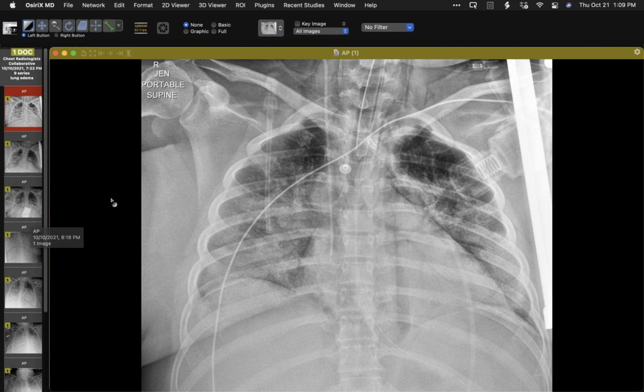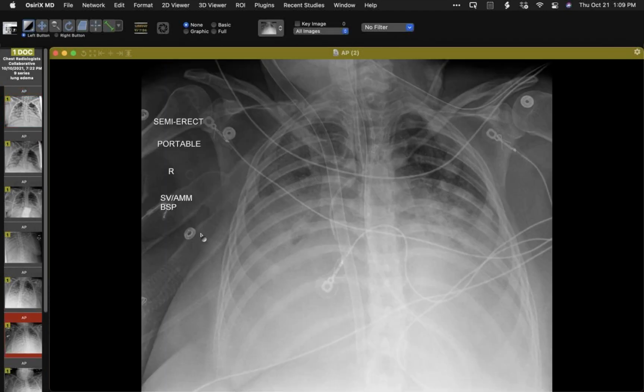Here is something that we're starting to see more often. We have a lot of patients here, even non-COVID patients, that require ECMO for various reasons. For example, veno-arterial ECMO, I've seen it before. In this patient, as you'll see, this patient later on, and I'll go here from the 10th to the 17th, now is being treated with a dual channel single jugular cannula, veno-venous ECMO.